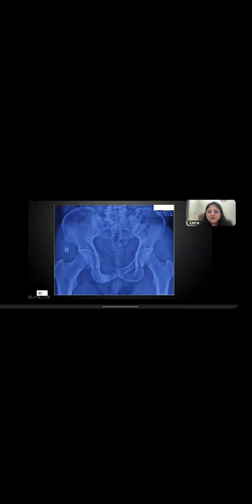The right superior pubic ramus is almost eaten away. Now, the thing to see in the radiograph is that the margins of the bone are completely destroyed. So even if I say that there is a narrow zone of transition, there is this abnormal bone and there is this normal bone. However, the bone has been eaten away. So this would not be a narrow zone of transition. This is more likely to be a malignant lesion.